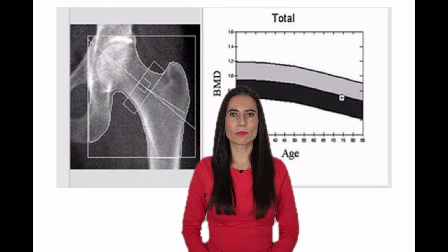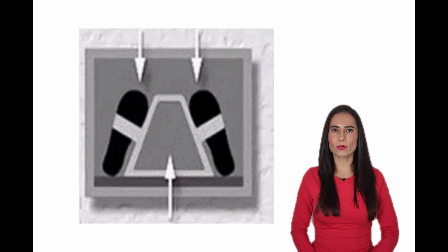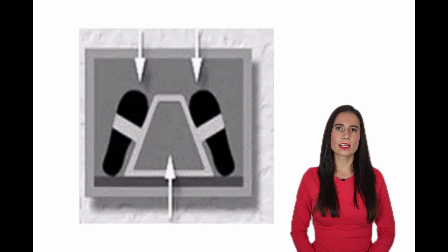As promised in our previous video, today I will briefly present you the common errors in DXA scan of the hip. Let's get started. Unlike the DXA examination of the spine, the legs should not be placed on a block but should be stretched out with the feet rotated inwards. If possible, the foot should be fixed on a block. Sometimes, of course, there are circumstances which make this impossible, for example, leg deformities.